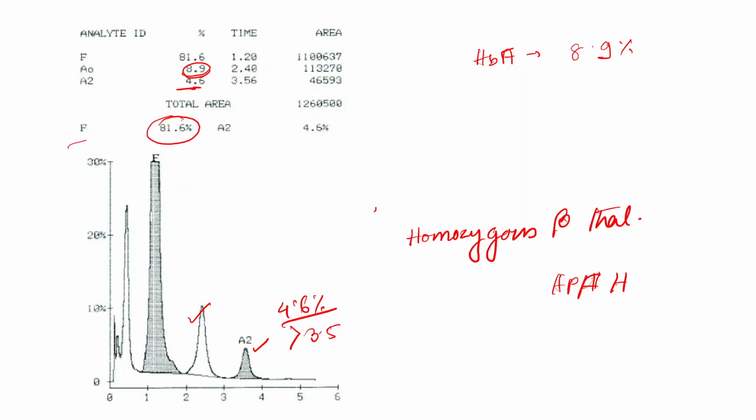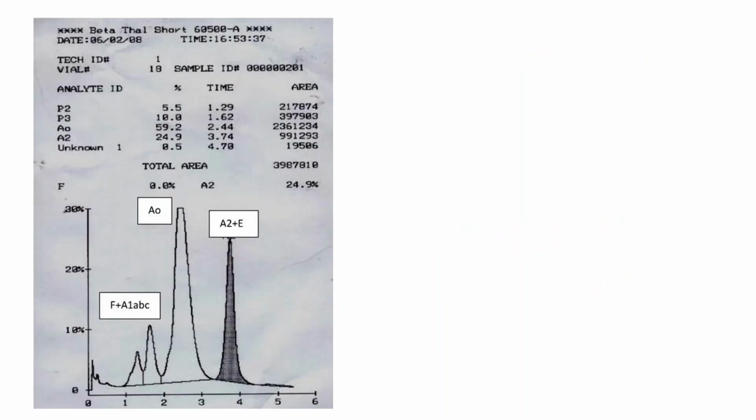There are many interpretations of high HbF values, but we will discuss them later on because those are very intricate details of HPLC interpretation. Okay, then moving forward to our next curve.